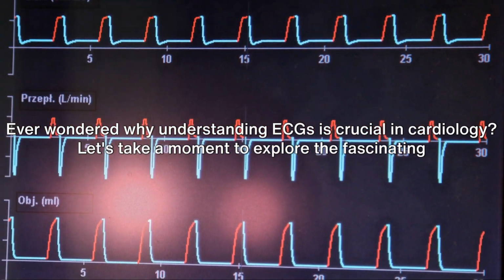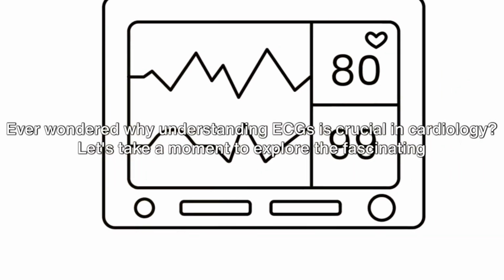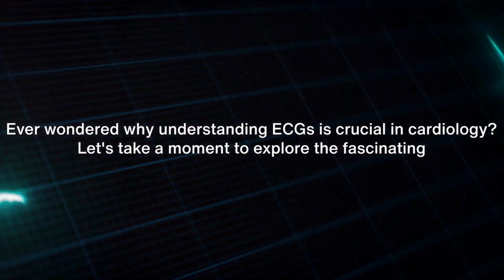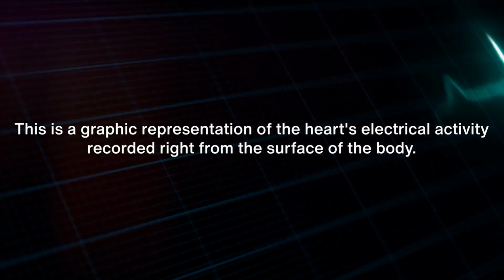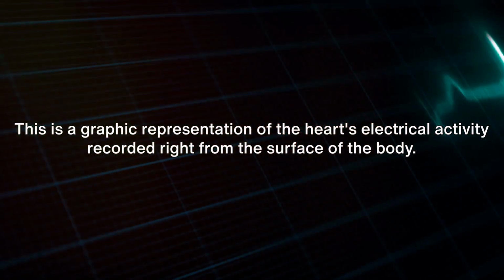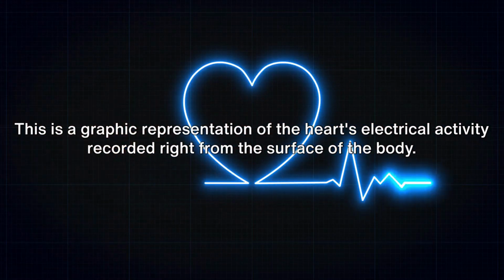Ever wondered why understanding ECGs is crucial in cardiology? Let's take a moment to explore the fascinating world of electrocardiography, commonly known as the ECG. This is a graphic representation of the heart's electrical activity, recorded right from the surface of the body.